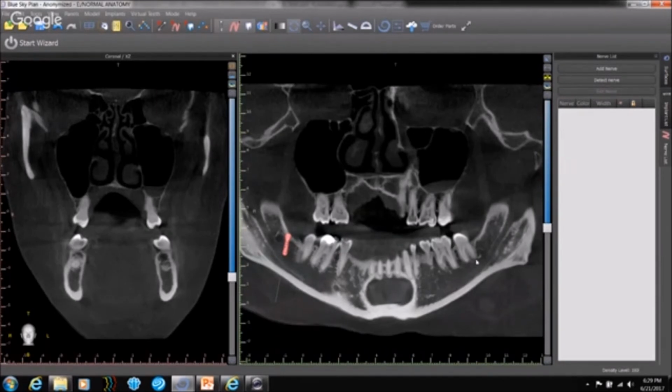Now, there is a propensity for a lot of people to re-image the patient, thinking that it's probably something to do with the images or the implant planning software, which you see here. No, it has got nothing to do with that. Probably the images were good, unless you see particular problems with the image. Probably it is just the way it is. And if it's not there, it is not going to appear, even if you try to image a few other times. So it is very critical to keep an eye on the top of the canal, and that cortical structure indicates the path of the canal as such.